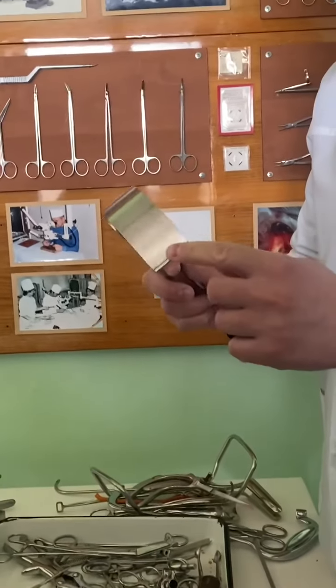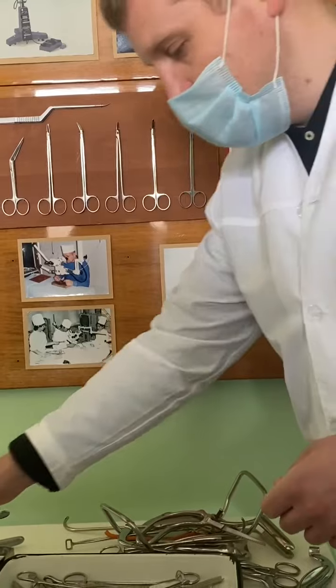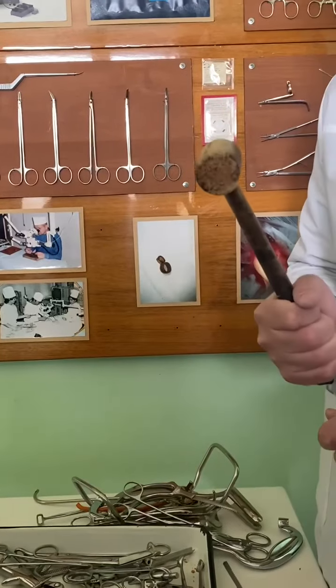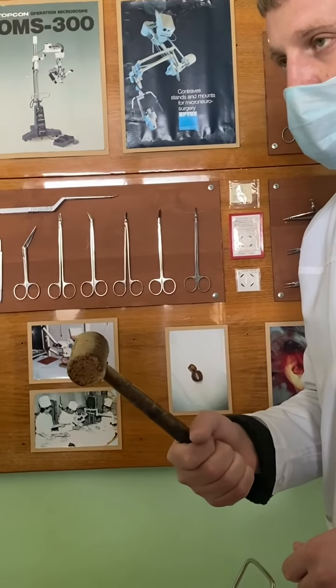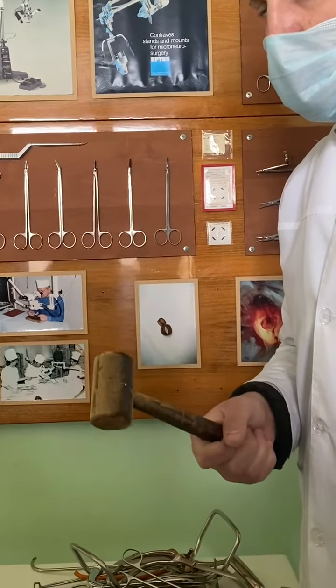Heart mirror. Elastic heart mirror to pick up the heart and check its backside during injury. This one, anesthesiological hammer. Yeah, of course no. It's a surgical hammer. We studied just one procedure when we need it. Next semester we'll study one more. Which operation needs a hammer?